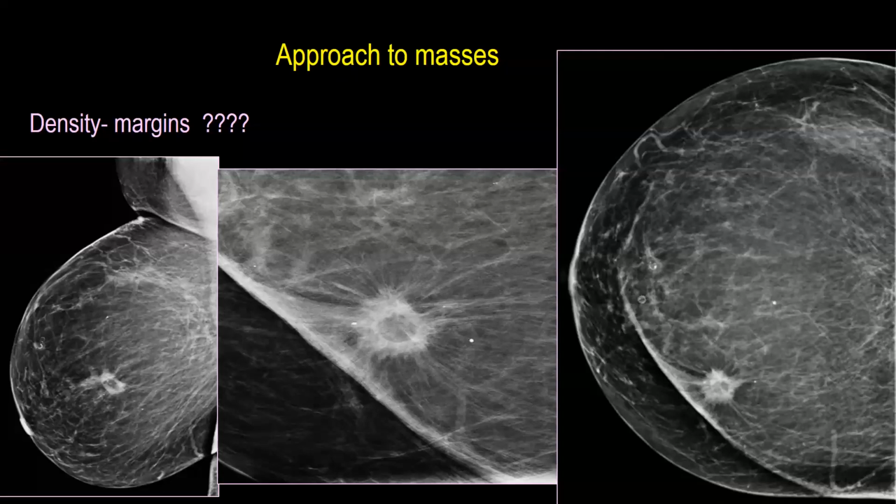If we haven't, we have to evaluate it to make sure that this might not be the previous location of excised cancer with recurrence in the same location. So we have to evaluate it further to make sure it is not associated with recurrence, but in this exact case, it was fat necrosis.